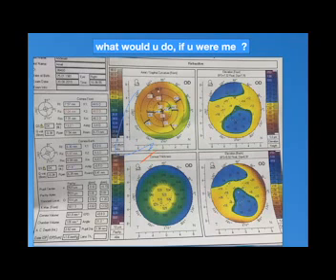What's your opinion on studying this Pentacam? What will you decide after the slides we talked about? The K1 is 44.6. The K2 is 48, right? The K-max is 50.1.